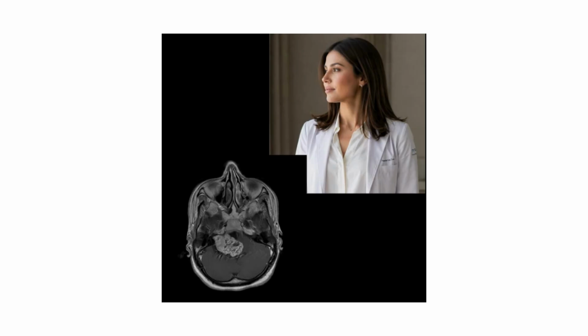Today, we aren't just looking at scans. We're solving the case of the silent angle. The clues: vestibular schwannoma versus meningioma. Let's walk through the most common suspect.